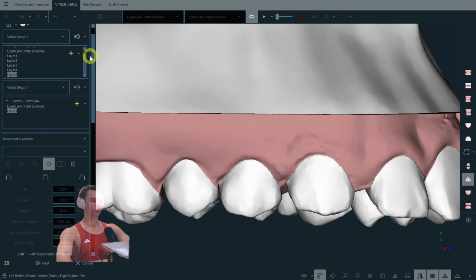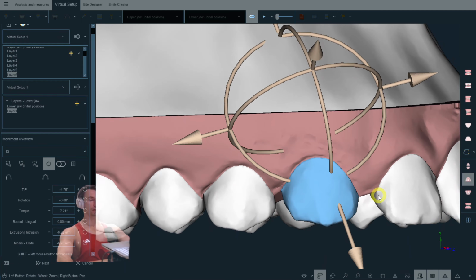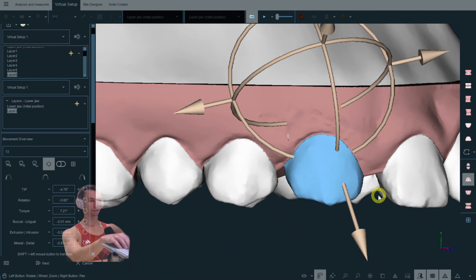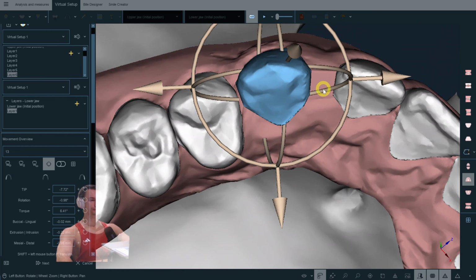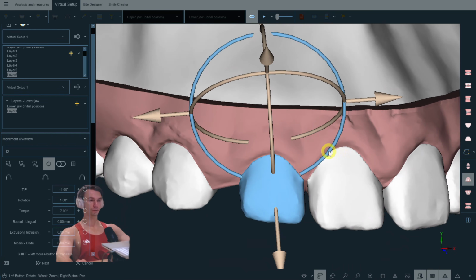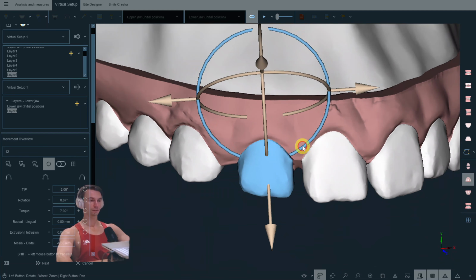So here we go. We don't move more than 2 teeth at the same time, even with having anchorage. We'll talk about it later. Because the patient has to wear elastics since the very first step. But even with the elastics, we cannot move more than 2 teeth at the same time towards the same direction. So here we go, and we're going to move the incisors using bodily movements.